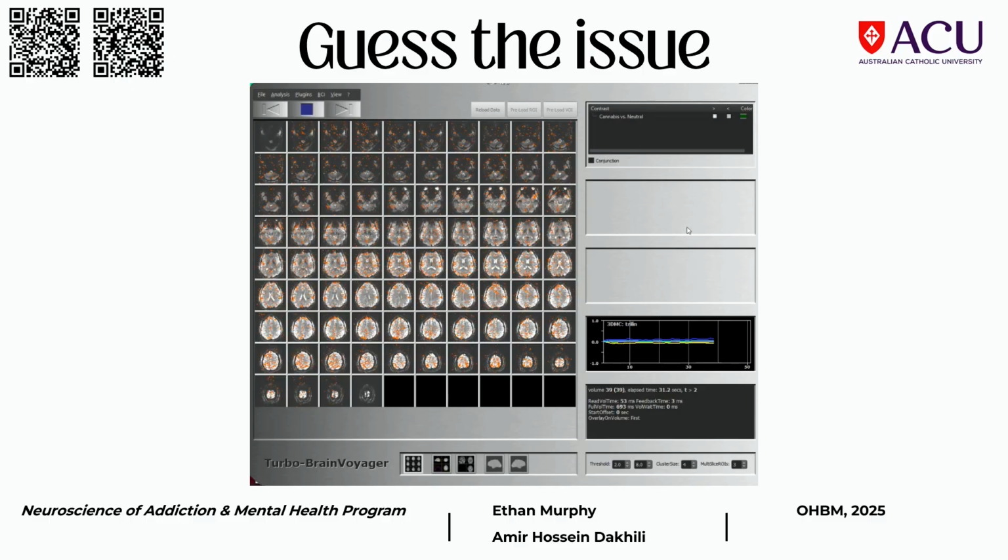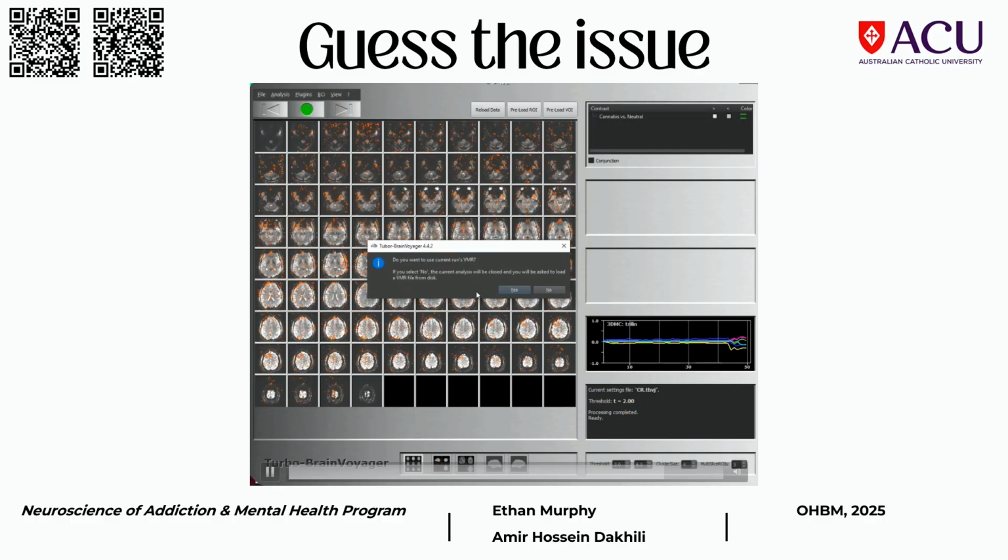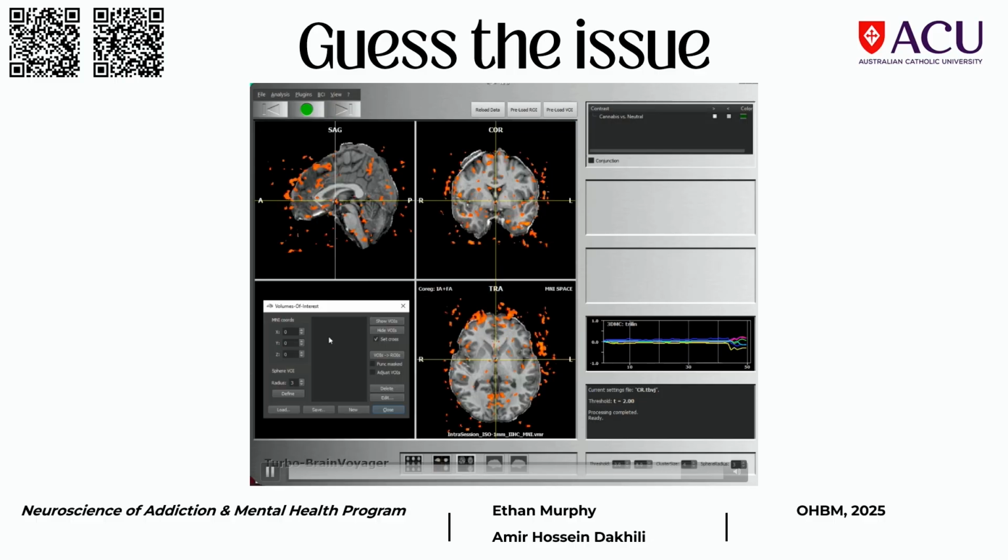Yeah, so the hint is the two boxes on the, is there a pointer? Yeah, there. So these two boxes are empty. Yeah, so these boxes actually. What should that be showing? And then that'll tell you what we're missing. This as well will show from Amir's presentation. There should be something here, but there's not. What have we forgot to do here? Close. I'll give it to you.